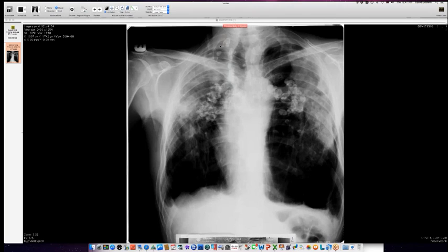Just because, well, I can't say for sure, but it's the degree of distortion and scarring that I think favors silica exposure over just coal dust. So coal dust is not as fibrogenic, at least in the reading that I've done. And so when you get extreme distortion like this, I think that is probably more reflective of silica and the intense scarring that it engenders.